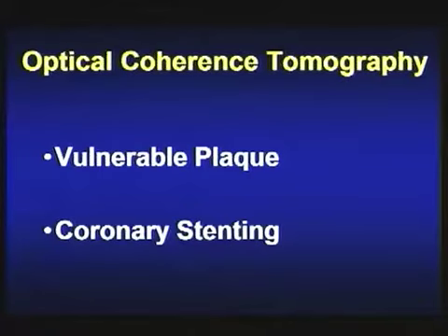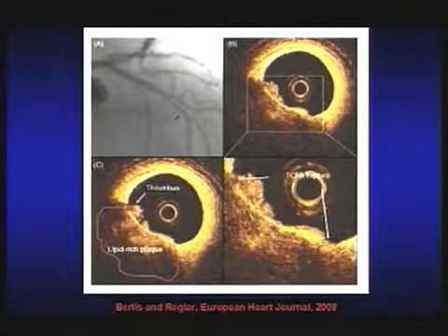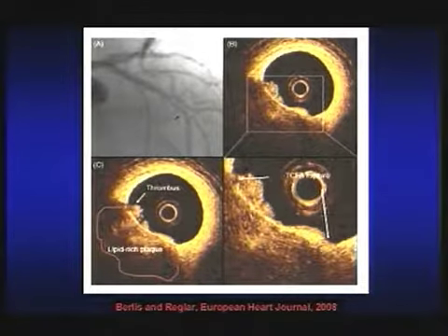Let's review quickly in the next 3 minutes the image of this anterior LAD vessel, in which you see in the upper right a thin cap fibroatheroma that has been ruptured at the shoulder of the plaque, complicated by thrombosis, as you see highlighted in the slide. This kind of resolution you cannot even dream of with any other technical devices.